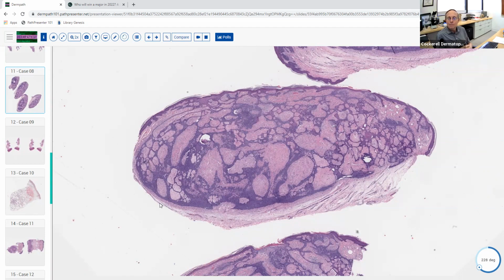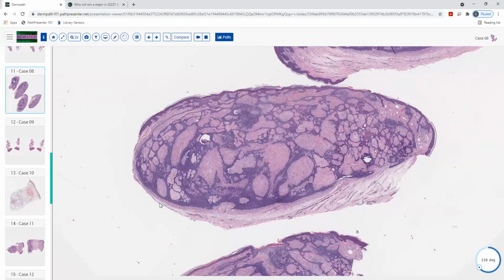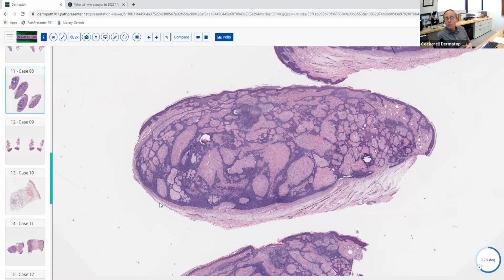Are you talking about follicular? Yeah, the hair follicle. That's the number one area. And there's two places of the hair follicle where basaloid cells live. So what are the two main places within that normal hair follicle structure where you can get these sort of primitive basaloid cells like we're going to see with our higher magnification here?